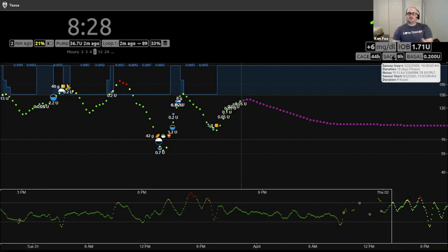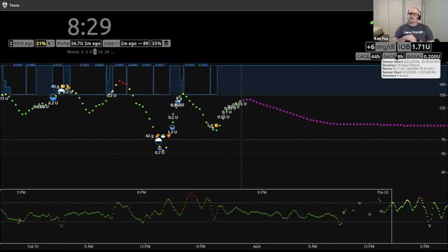Sage is the sensor age, or your CGM sensor. This is actually a really good time because I did a restart today. If you hover over that, you can see a couple things. One, my transmitter ID, which I guess I should have taken a picture of and hidden, but that's okay. You can see the time I inserted it. I used a couple different activities, and we'll review that in a minute.